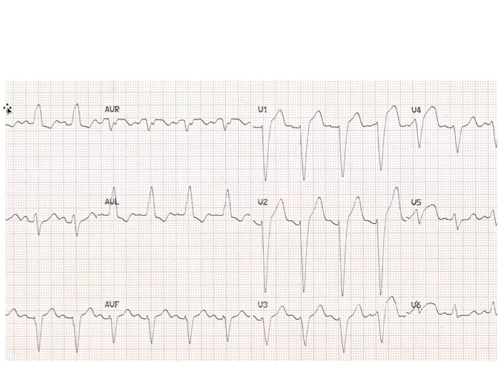But if you have a new developing left bundle branch block in a previously otherwise healthy adult or child for that matter, this is a ST elevation equivalent. This is an MI equivalent. So what it means essentially, if you have a new documented left bundle branch block in the episodes of chest pain, this is considered to be the patient is having an MI. That is the rule with this.